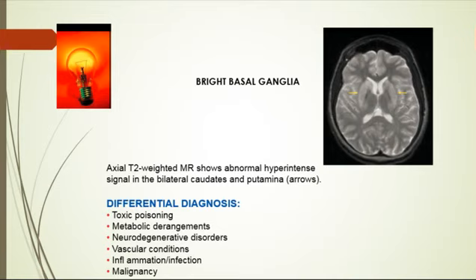So it's bright, very non-specific sign, okay? Other features systemic lupus erythematosus, Behçet disease, neoplasms including CNS lymphoma and glioma. However, bilateral symmetrical will be very unlikely, okay?